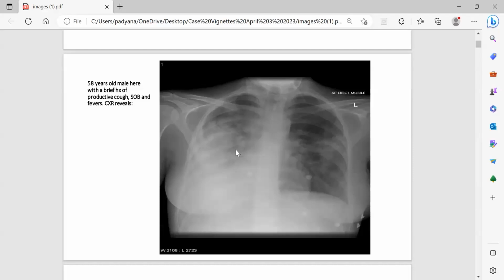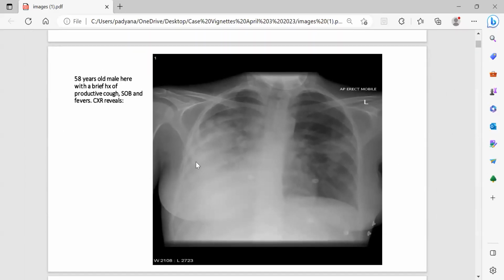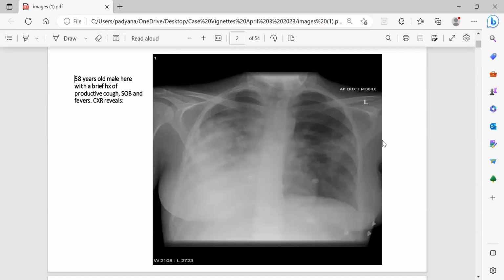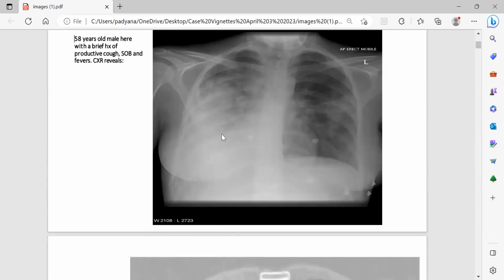So we always describe the lung lesions as homogeneous or non-homogeneous, isn't it? So a lesion on the right hand side, is it homogeneous or non-homogeneous? Yeah, it is non-homogeneous. So involving mid and lower zones, and I think you commented on the rest of the things like air bronchogram, and all that, consistent with consolidation or pneumonia. Yeah? Yeah.